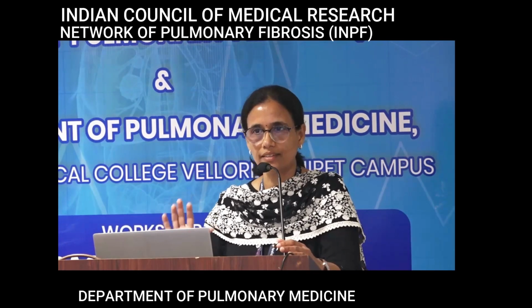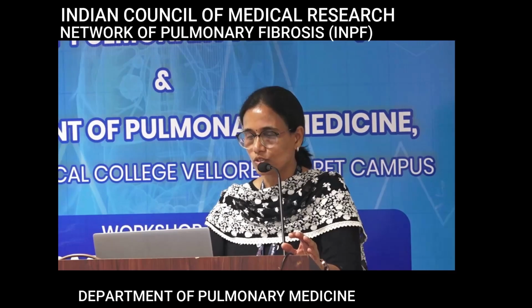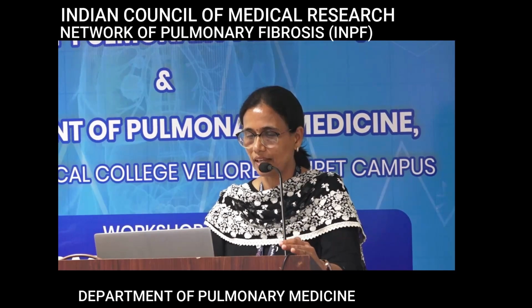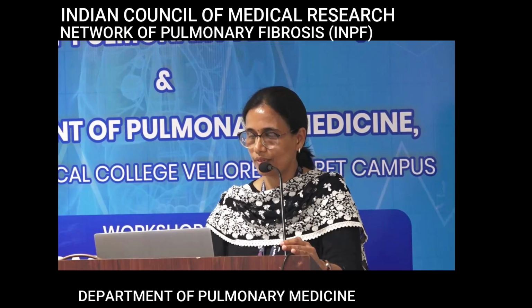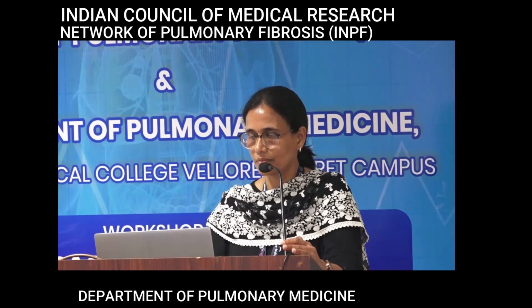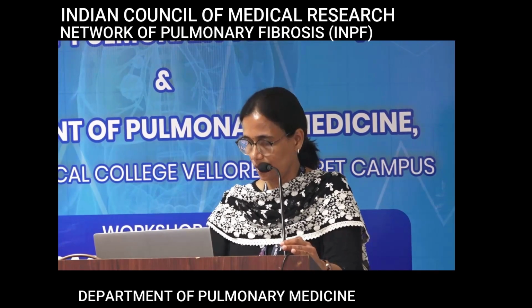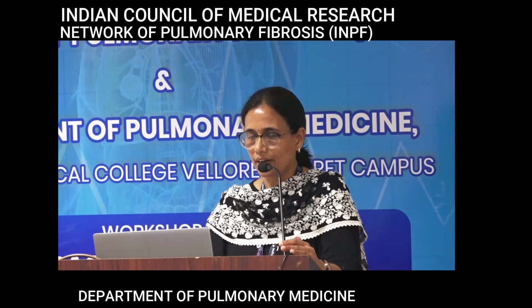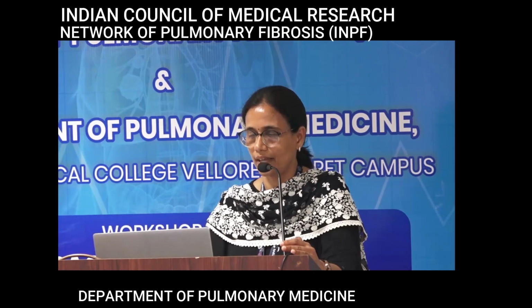So what are we saying? Already we are starting to see that there is a lot of fibrosis, right? Honeycombing is the hallmark of fibrosis, we said. It's starting in the upper lobes itself, a lot of honeycombing in the upper lobes. And we are also seeing small areas of air trapping. A little bit of ground glass, not much, mainly it is honeycombing. And as we come to the lower lobes, there is less fibrosis compared to the upper lobes. Again, we are seeing some areas of air trapping, and we are starting to see the three density sign in the lower lobes, where we are seeing normal, ground glass and air trapping.